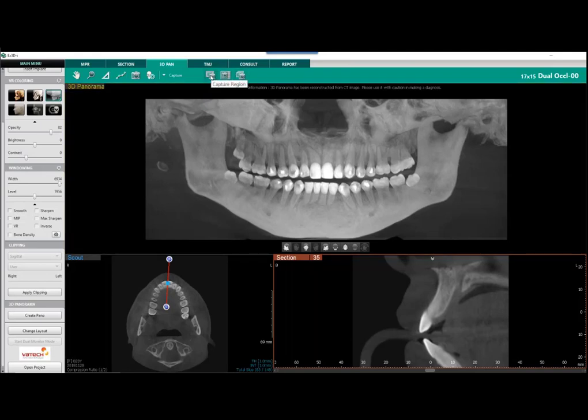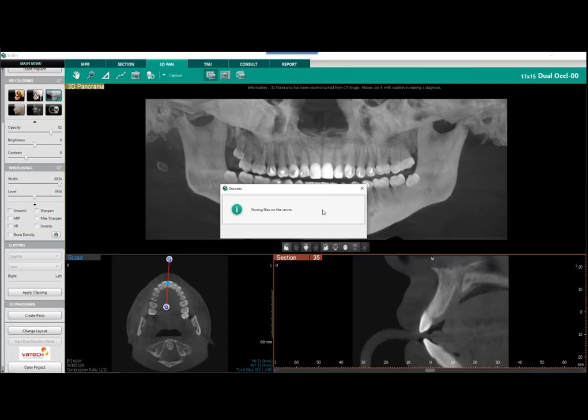So the first one is a Snag-It or a clip-it tool. It's called capture region. If you're familiar with the clip-it tool in Microsoft, it works the same way. You're going to click in the upper left hand corner and drag and then let go, and it's going to capture just that window as you see there. So it captured that little section.